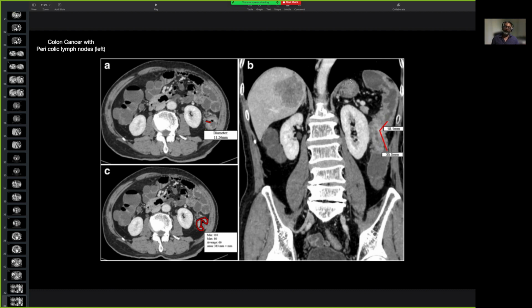That should be the spleen. Spleen or the stomach, depending on how far back we are. That would either be the spleen or the stomach. Well, look, you can get that wrong, but if you actually had the CT, you could scroll forward and back. So that is the issue. I mean, expecting people to identify just on one plane is a bit hard, unless it's obviously the liver, or the kidneys, or the psoas muscle, or iliacus muscle. Well, you've learned a bit today.